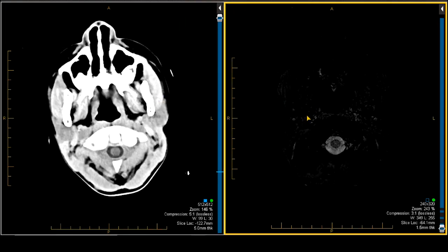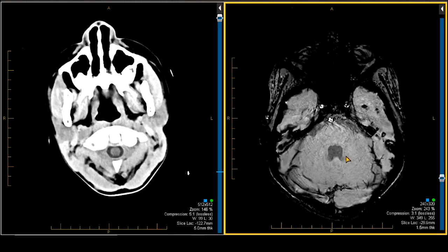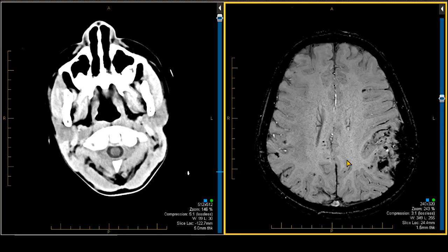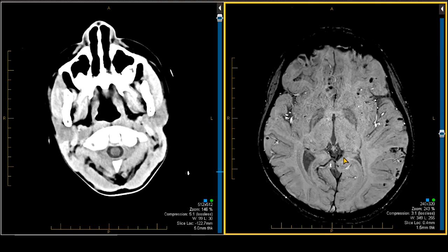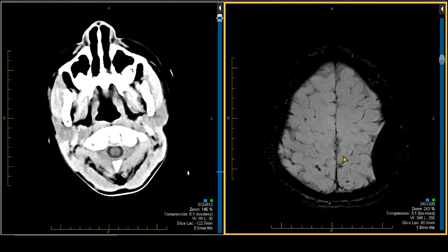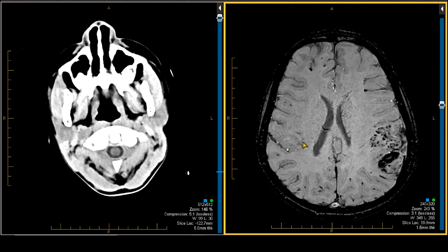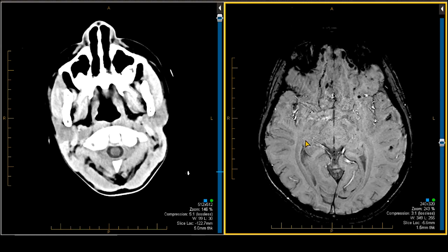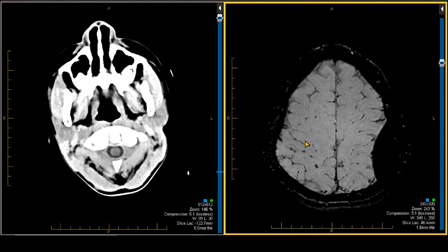This is the power of MRI, in particular with susceptibility weighted scanning. In a patient who has discordance between the imaging findings on CT and the neurologic deficits, one should definitely recommend susceptibility weighted MRI scan in the setting of potential diffuse axonal injury.